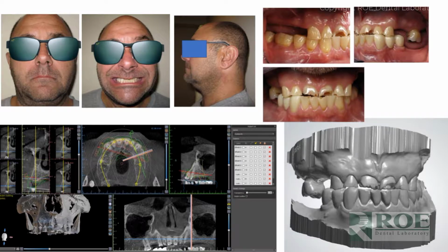And the photographs on the top right, which are always retracted in occlusion. We always want to see how the teeth are coming together so that when we articulate the case, we can confirm that the bite is correct. And then the patient photos, which is full face, full smile. In this case, also repose, and then a profile if it's necessary as far as lip support, overjet, class 2, class 3, that type of thing. So these are the general records for a CHROME case.